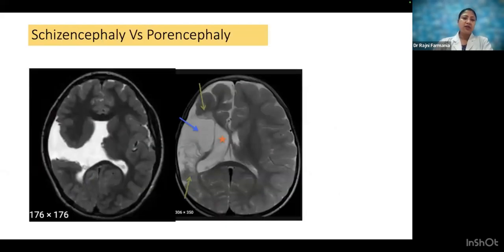Schizencephaly is another cortical malformation wherein you see the cleft. So, open lip or closed lip schizencephaly, and the important differential is a porencephalic cyst. Sometimes you get these kinds of features where you can see some gliotic cysts which are larger. So that's called a porencephalic cyst. And here you can see features of gliosis. In open lip schizencephaly, you can see cortical structures very beautifully lining the cleft. So do not miss this.